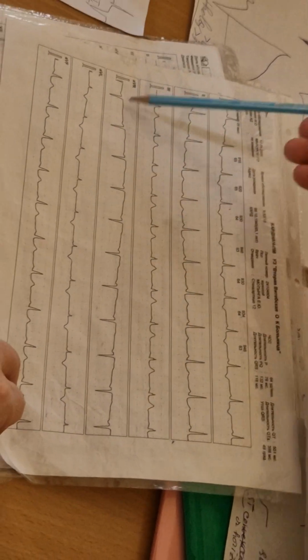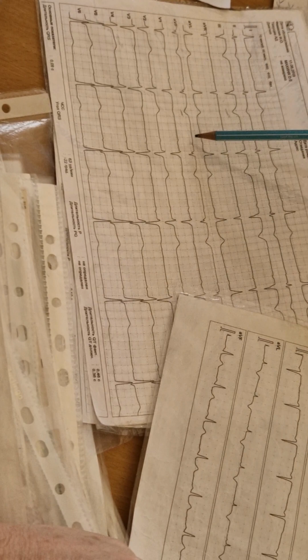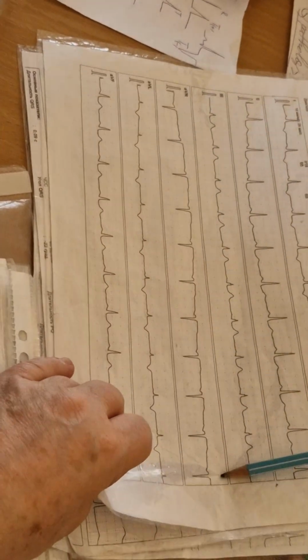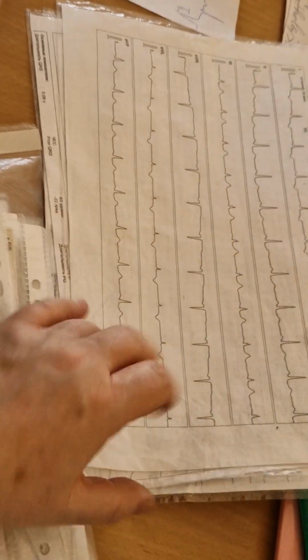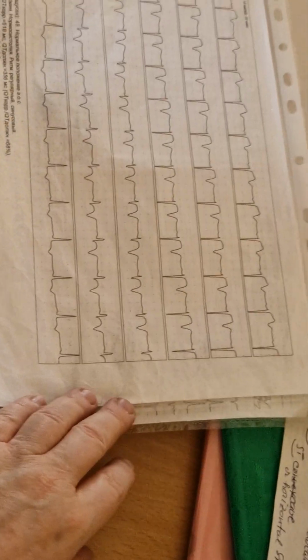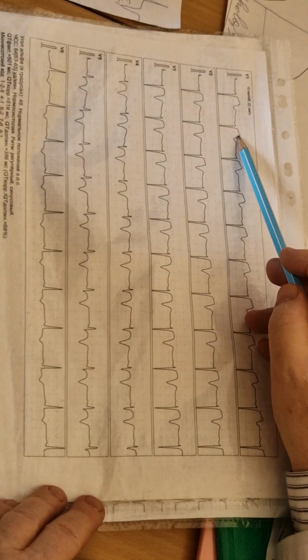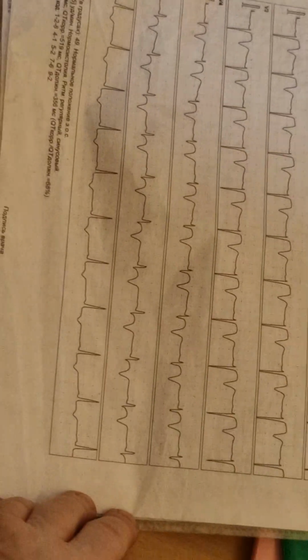aVR is normal. aVR is not used for infarction diagnosis. To see, here only split. What is normal aVR? Because aVR positive pole is opposite to the other leads. The other leads have positive pole left and down. I want to see chest leads. To see here a small R wave, but it's still like T negative.